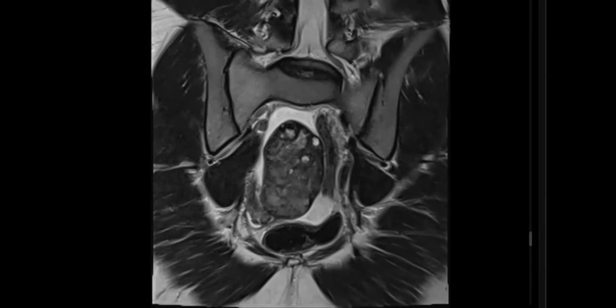Yes, some chronicity can be seen with scanty enhancement. Yes, but it can be saved. With preserved enhancement, it can be saved. With massive edema, it can be saved.